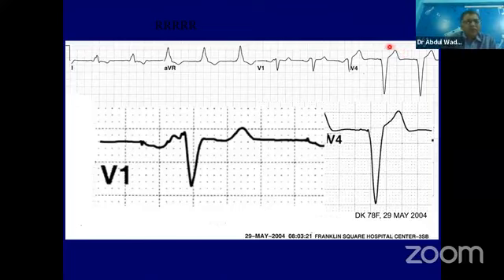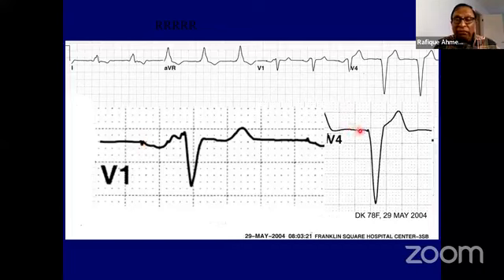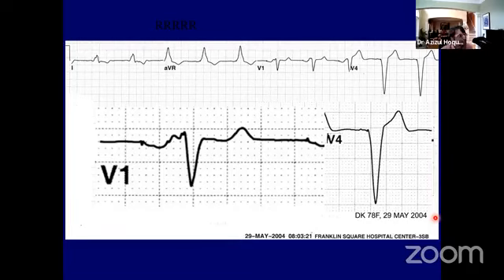So I have magnified V1, there is a pacing spike. And in V2, the ventricular spike is very difficult to see, but in V4 you could. And Wadud mentioned something important. Lead 1 looks like left bundle, but from V1 to V4, there is a QS pattern. It's very, very unusual for that to happen unless the leads are misplaced or the rhythm is independent.